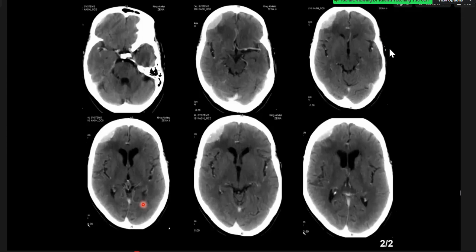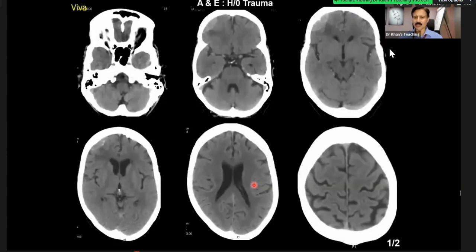Excuse me, have you noticed that I've shown you the next meningiomas, maybe an en plaque kind of meningioma? This is a meningioma. Yeah, that was a trick case. It's a trick case which can come in the exam. You see, this is a classical trick case where you assume things. And by the way, this is what happened in this case. This presented with a history of trauma. And the key thing is that this is a meningioma with calcifications. You start thinking, why calcification?